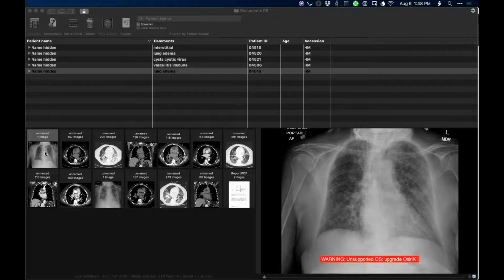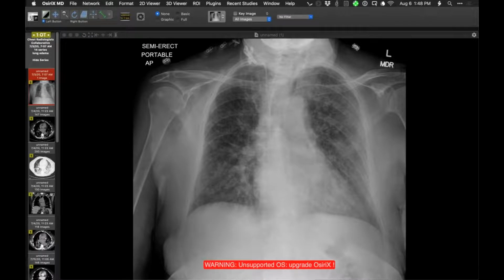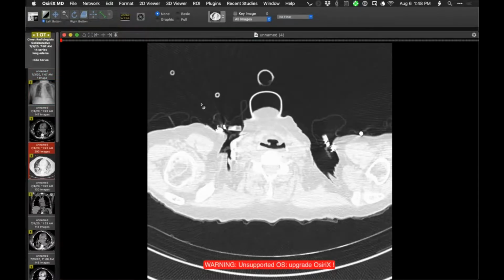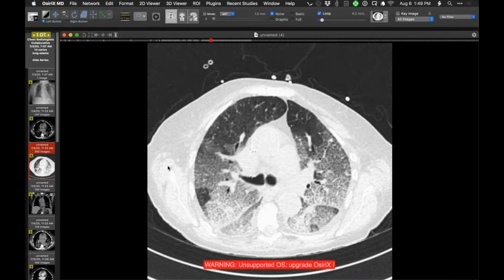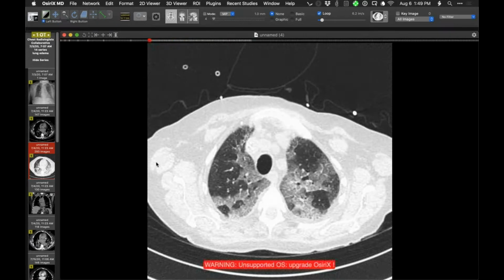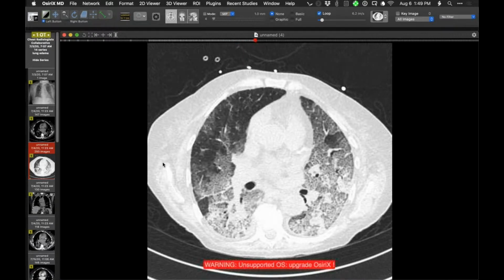This is a patient that was admitted to our cancer center, and treatment was started for a condition which I'll tell you about in a moment. But she became pretty symptomatic on about day 2 of the institution of therapy. So this is bedside radiography, July 3, and this is the CT showing a very extensive abnormality. Obviously, this is a very nice example of a crazy paving sign. There's diffuse abnormality in the lungs, though some areas of sparing. The distribution is extensive, but a bit odd.